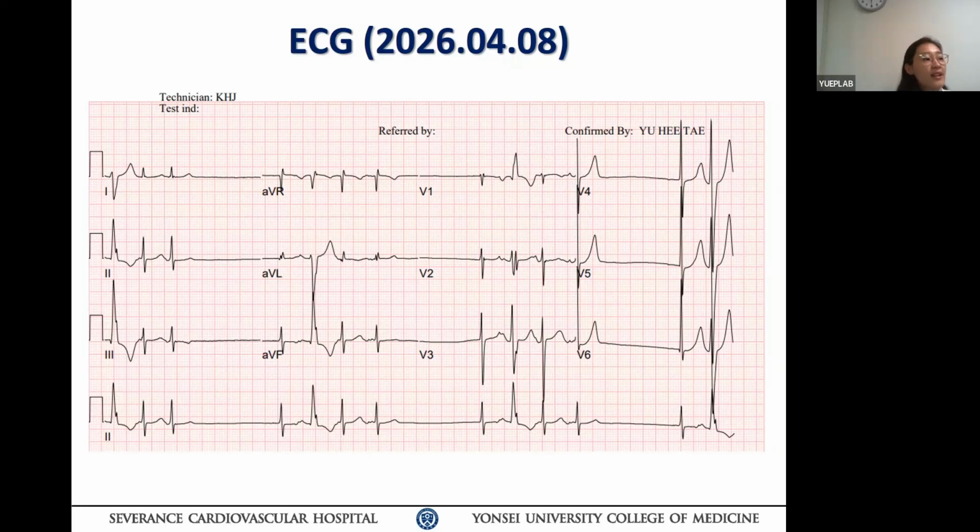Go ahead. Good morning, everyone. Today I'm going to present an ECG case. This is our today's ECG. Okay, who will start first? Who will take it first? Traditionally, the people closest to the screen.